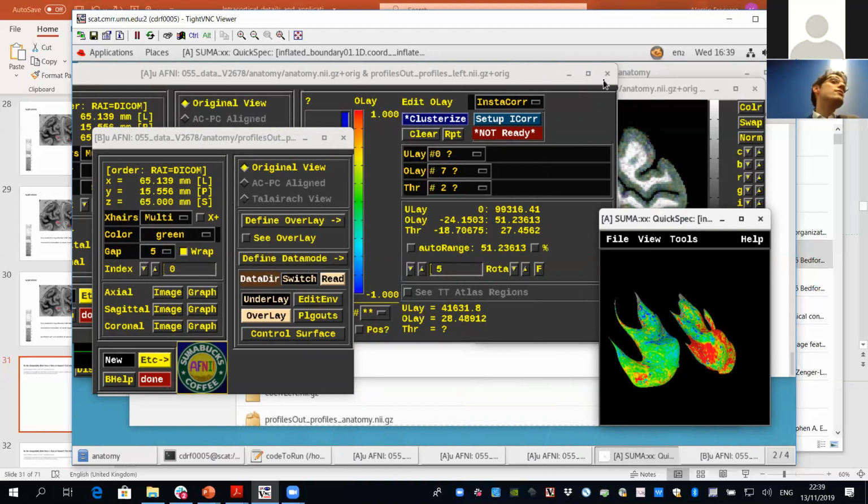As long as you have a good segmentation to start with, the method works. It doesn't care about the beginning contrast. As long as there is enough contrast between gray matter and white matter, it should work. That's the challenge, really.